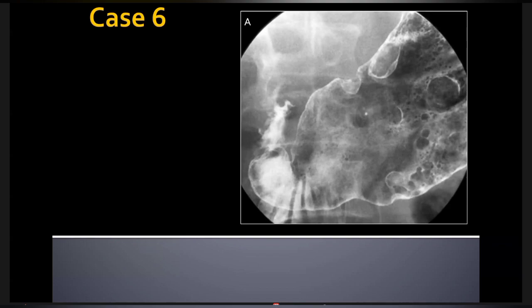So I totally agree with your description of how you define something as an ulcer on a fluoroscopic study. So my question to you is, what you're actually seeing here, do you still think these are ulcers? Madam, I will say that I cannot see a crater ulcer. These filling defects might be the polyps.